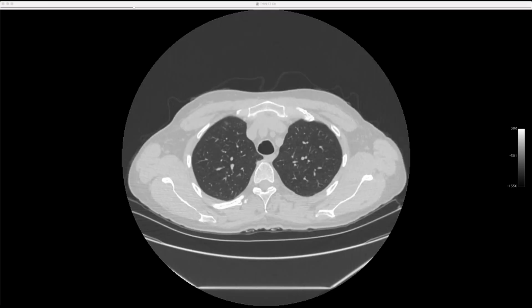I'll send that one along. And then this is just a follow-up of Julie's case that she had sent. I showed it a couple of weeks ago, I think. This was one I looked at. I can't remember why, totally unrelated, but I was immediately struck by these tracheal nodules.